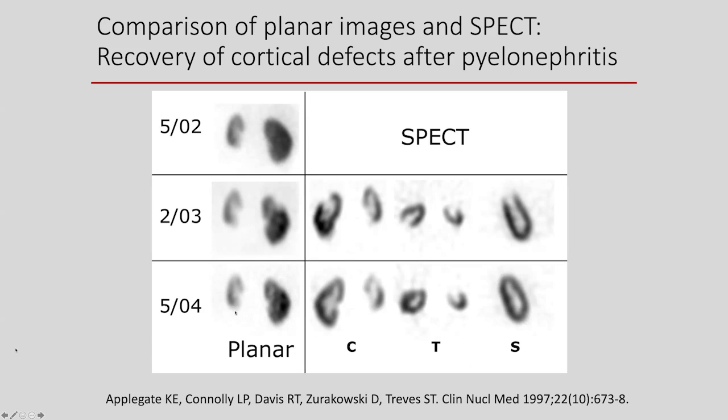The patient got better, and you can see that this defect has essentially disappeared over time. It still is suggested a little bit on the images, but there's clear evidence of recovery of renal function, very clearly seen on SPECT.